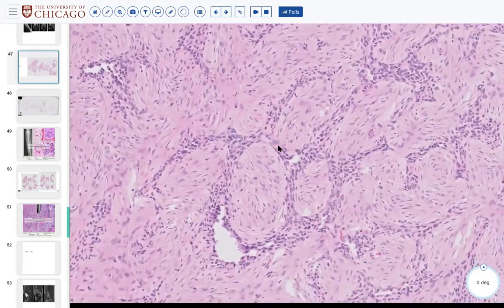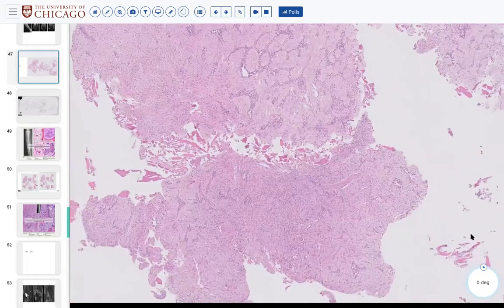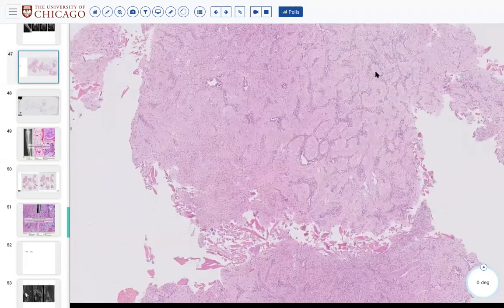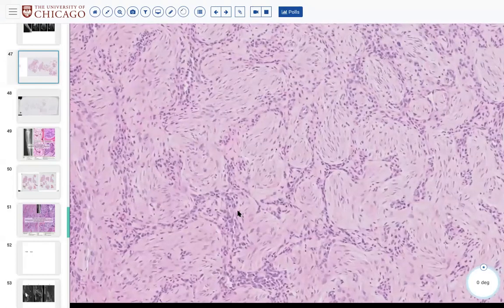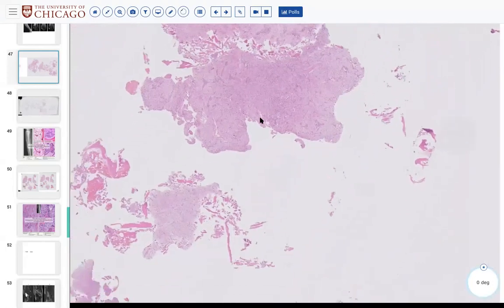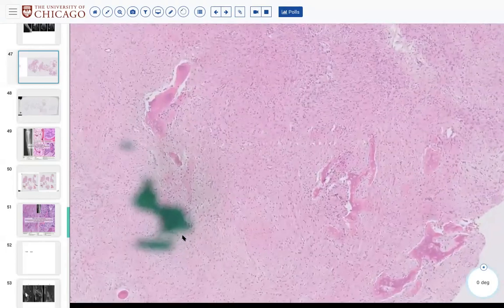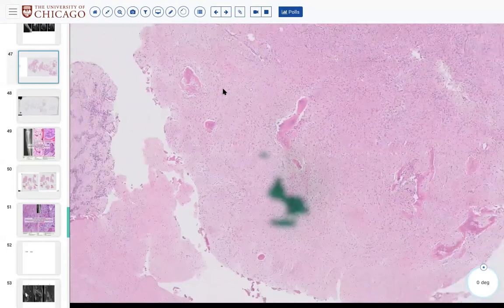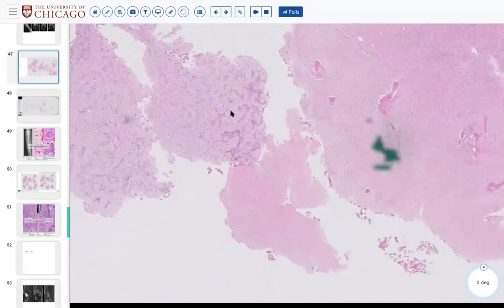So tell us about adamantinoma, either Jasmine or Perry. I know it has those classic little epithelioid islands. I guess these didn't look quite like the image that I'd seen in a textbook. I thought they were more islandy in the book, whereas here they almost look arborizing or like a network. I don't know if that's a totally acceptable variant. That was my first thought when I saw this, although this area doesn't really have them.